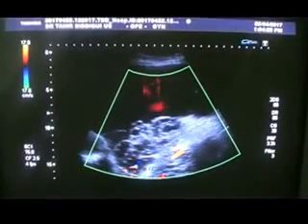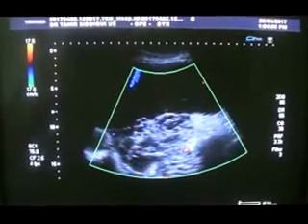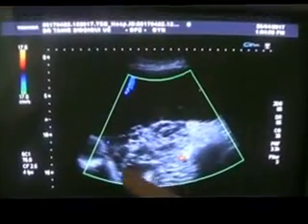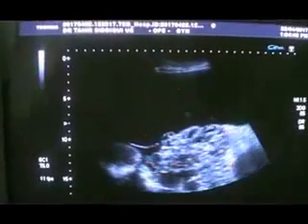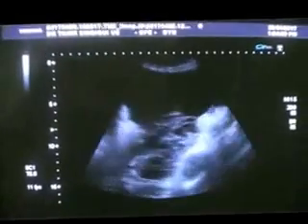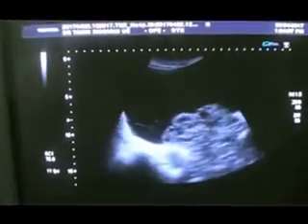There is no evidence of any blood. I don't see any blood within the septa. No septa contains any blood, otherwise the situation would have been an aggressive one. So lucky enough she is not to have blood within this septated area, multi-septated area in the dependent region.